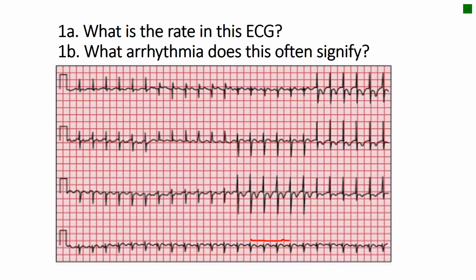That's tachycardia. Then we have to ask ourselves, is this ventricular or atrial tachycardia? And we look at the QRS complex, and are they wide or narrow? Here they're very narrow. So this is an atrial tachycardia. Now, if you know something about ECGs, a rate of 150, until proven otherwise, is atrial flutter 2:1. Atrial flutter 2:1. So it's a problem with atrial tachycardia.